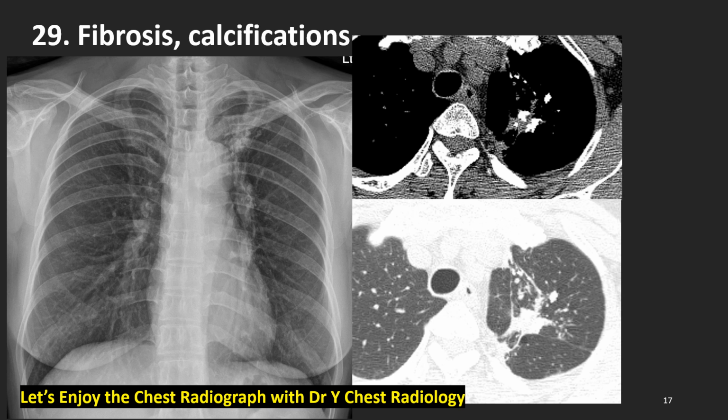She is a middle-aged woman. Left hilum does not look good. Right side is normal for comparison of left side. Left hilum is more elevated with deformity, with many calcifications, well-defined nodules, peribronchial fibrosis. Left side diaphragmatic pleura is looking good. Let's look at the axial non-contrast CT. Yes, fibrosis with multiple well-defined calcified nodules. How about the lung window setting? Fibrosis, calcifications, traction bronchiectasis, volume decrease.